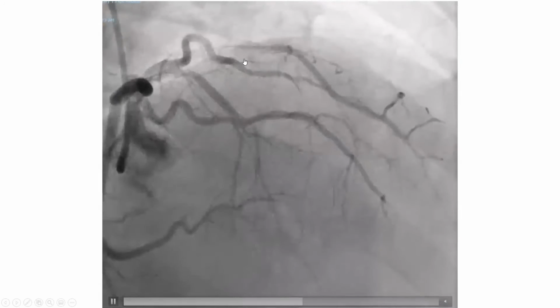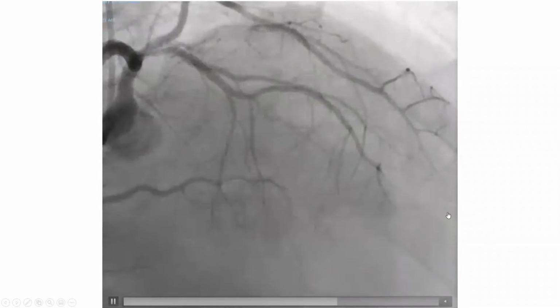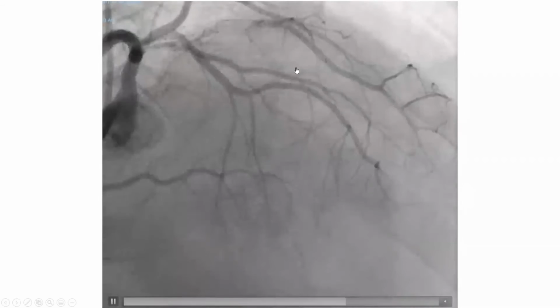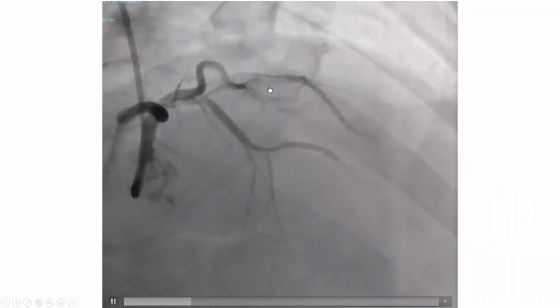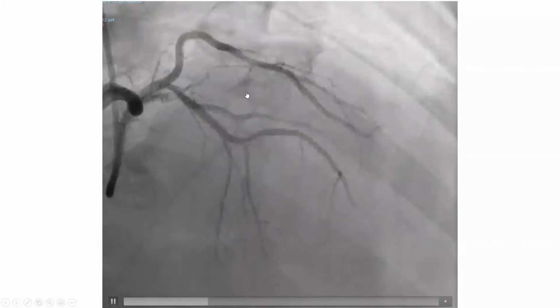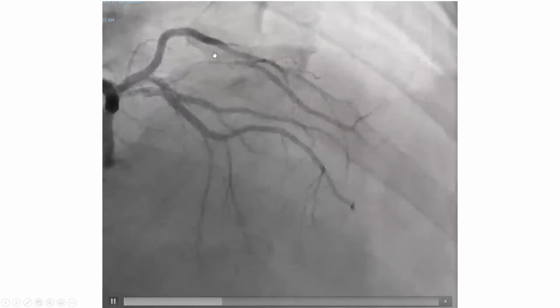And when you get lost, you don't know what's going on. Maybe there is disease. Look distally. See where the vessel is reconstituting or forming distally and go backward. Okay, this is the vessel distally. So there is a big lesion here. There is a big, long lesion here. What's the diagnosis here? Just look at that angiogram, you need to be able to make a diagnosis.